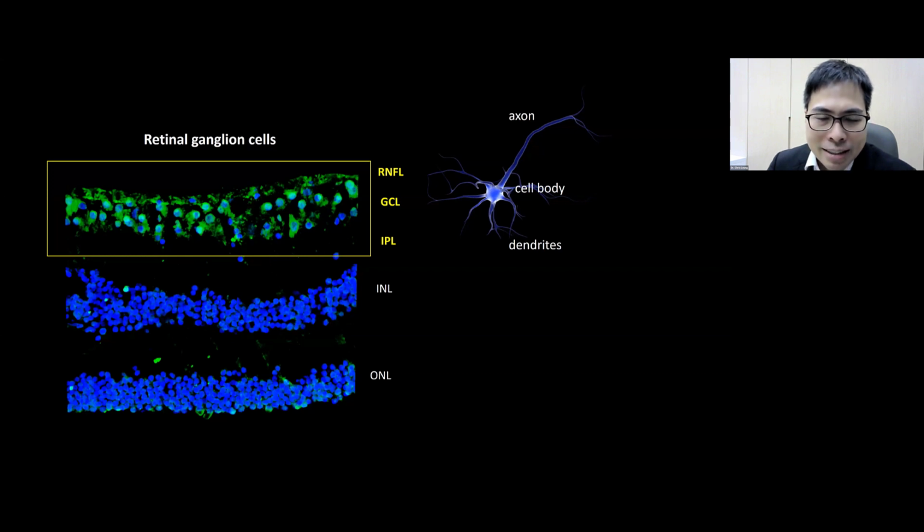We notice that this section corresponds to the macula because we see many layers of the ganglion cell layer. We don't typically image the retinal nerve fiber layer alone when we evaluate the macula because the RNFL is relatively thin over the macula. It is relatively thick over the optic nerve head region, but relatively thin over the macula.